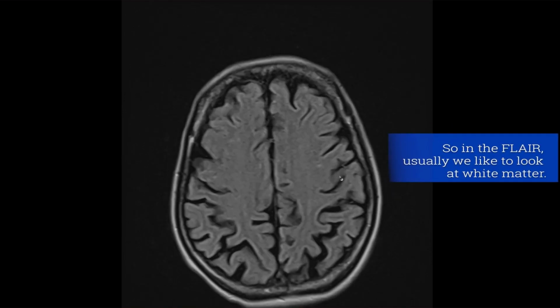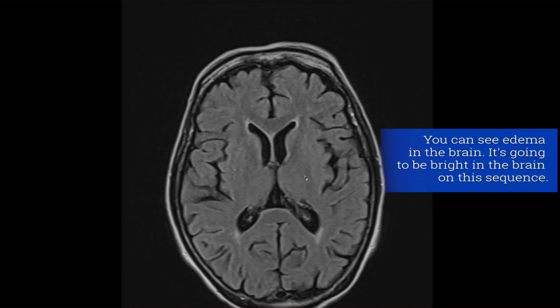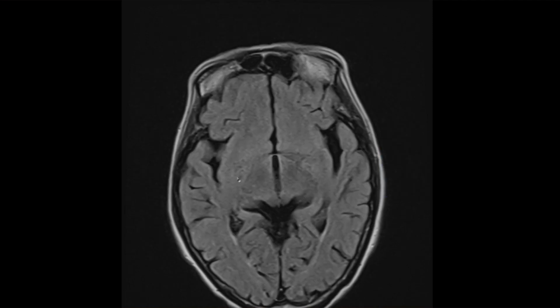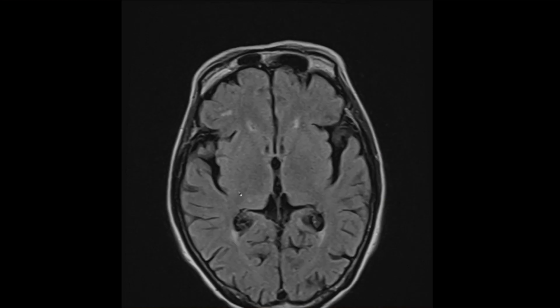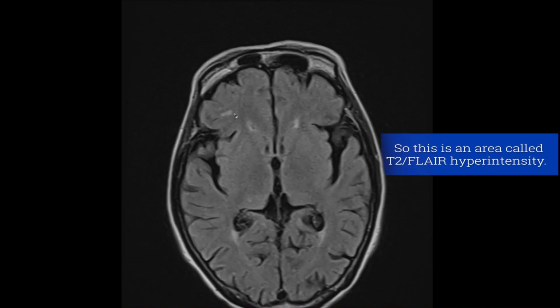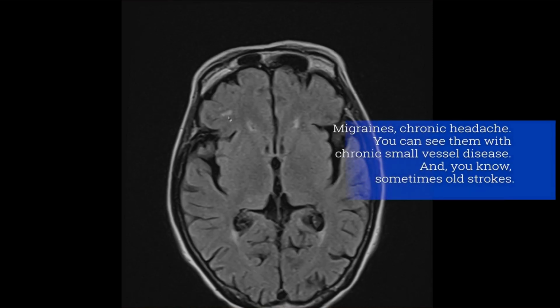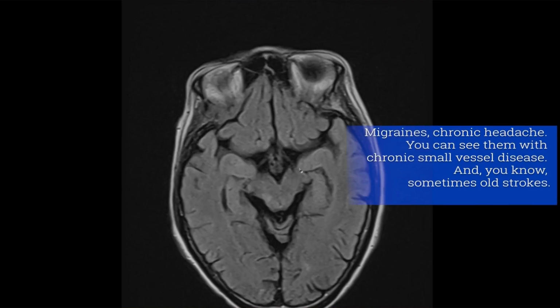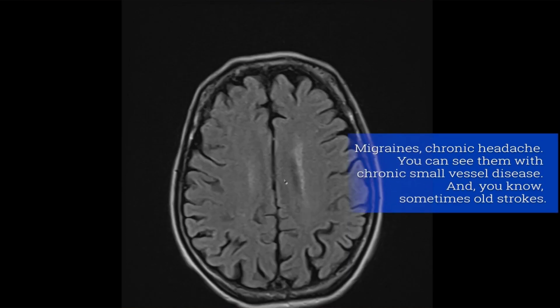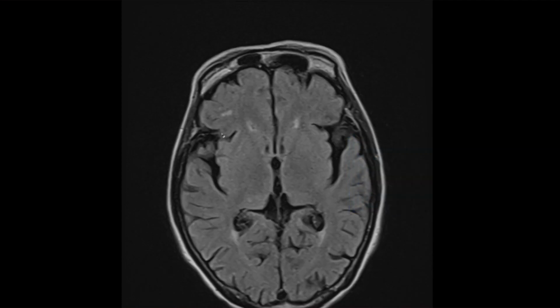So in the FLAIR, usually we like to look at like white matter. You can see edema in the brain. It's going to be bright in the brain on this sequence. You can see gliosis, you can see tumor. These things, so this is an area of what we call T2 FLAIR hyperintensity. So you can see these in a couple of scenarios: migraines, chronic headache. You can see them with chronic small vessel disease. And sometimes like old strokes, but those typically further out.